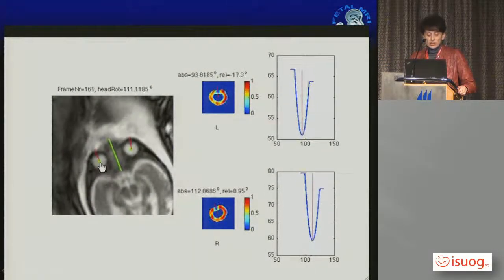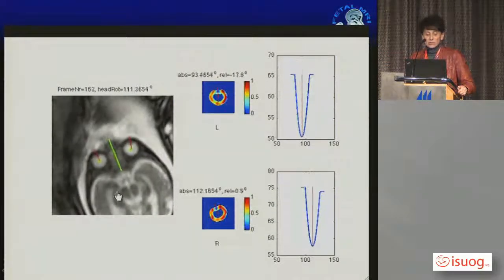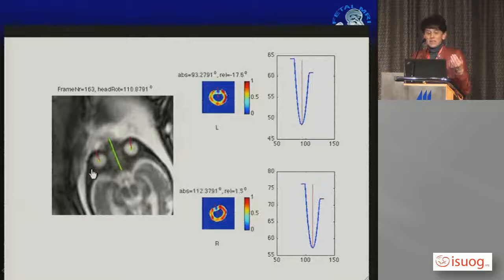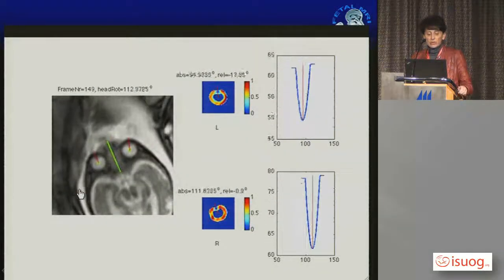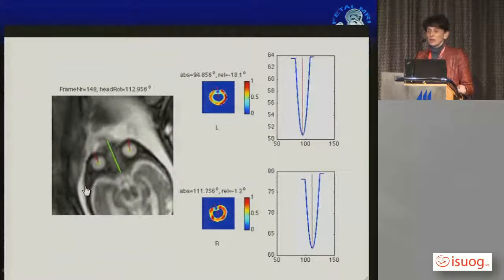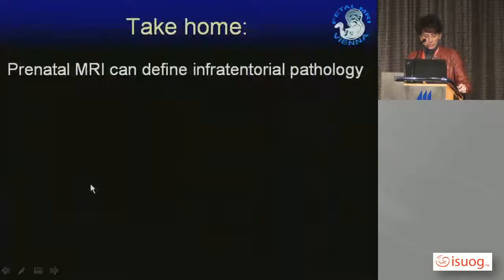The fetus turns the head and the eyes stay already centered. This is possible to see after gestational week 30. So if we see this, we learn a lot about the nuclei of the cranial nerves in the brainstem. And of course, our science has gone further, but I am not allowed to tell you that we have already located the cortical representation of these movements.